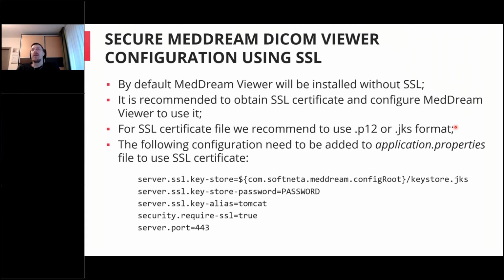When you install MedDream, by default it will be installed without the SSL certificate, just so it will be easier for you to try it. But when you are testing, or when you plan to go to production, it is recommended to have the SSL certificate and to configure MedDream to use it.